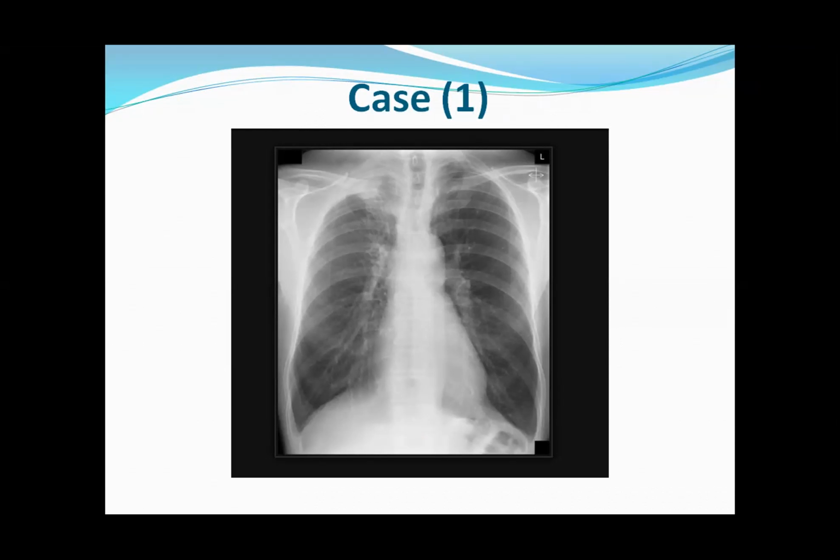So in this case, I'm suspecting a Pancoast tumor of the right lung. The patient has to be further investigated using a CT chest for confirmation of the diagnosis. And if it is a Pancoast tumor, the patient has to undergo a biopsy, the tumor tracker has to be activated, and the patient referred to the chest MDT for management.